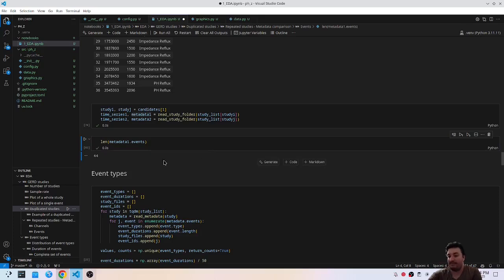So I'm thinking maybe some of the events are the same version 2 times, and the doctor selected a subset in the first one and then completed, and they are saved in 2 different sets of files.